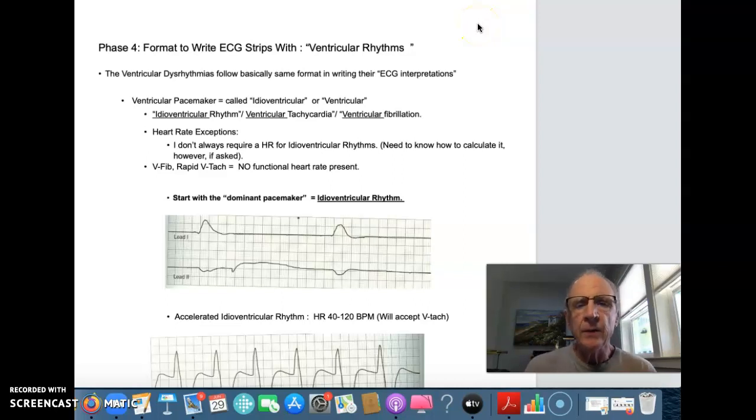This video is going to focus on how you would write an ECG interpretation when the dominant pacemaker is located in the ventricles. Ventricular dysrhythmias follow the same format when you're writing their interpretations from an ECG. Some of the slight variations that are peculiar to a ventricular dysrhythmia is sometimes how we name the pacemaker. For example, it could be called an idioventricular rhythm, or it could be called a ventricular rhythm.